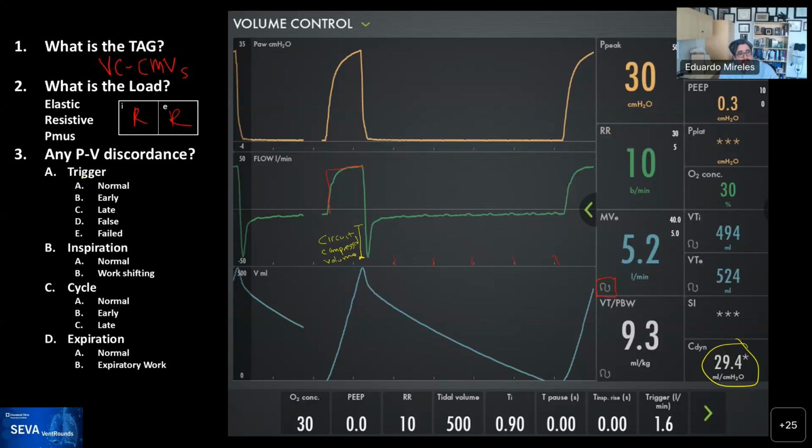And some of you recognized these little perturbations on the flow that are pretty rhythmic. If you start seeing them in order, you realize these are cardiac oscillations occurring in a very rhythmic contraction and oscillation.